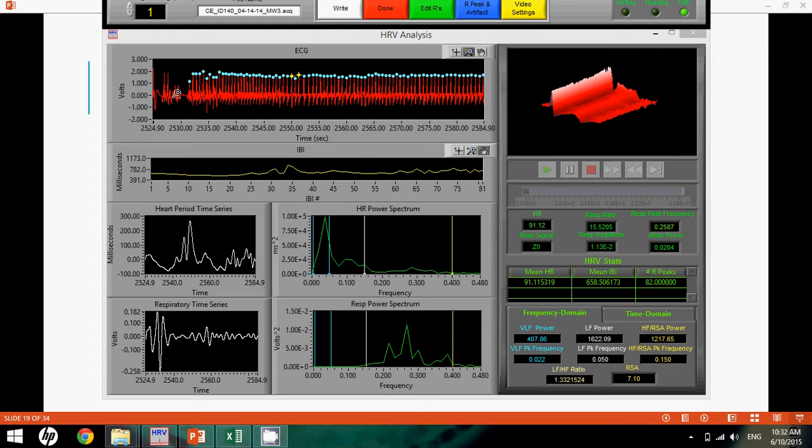So we'll say that this is actually a valid segment, even though this first 10 seconds or so of the data is omitted. And this is for the big reason that the initial R spike designates that everything else is valid afterwards and everything before is deleted.